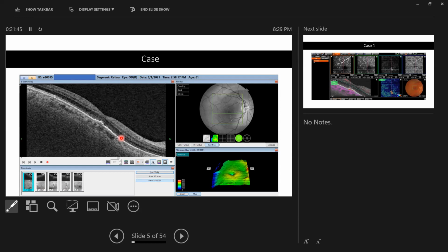So just keep your patient screening his or her vision, and you have to inform him that when he gets any drop in vision, he should come immediately to the clinic. So we should do OCT angio. In the cases of the silent CNV, yes, you need the OCT angio, otherwise you cannot identify them. You will never pick them up with the fluorescein. You're not able to see the silent CNV with the fluorescein angiography. But on the OCT angio, you can easily pick up the silent CNV.